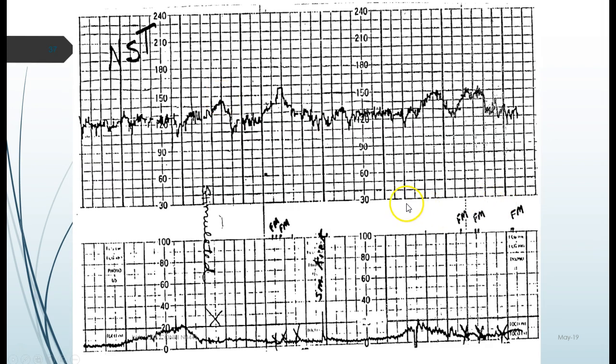Here's another strip. If we look and we draw a line where this fetal heart rate hangs out most of the time in between contractions, here's the 120 line, there's the 130 line. Would you buy that it's hanging out about halfway between 120 and 130 most of the time? So 125. Stimulated, meaning that we did something to stimulate that kiddo.